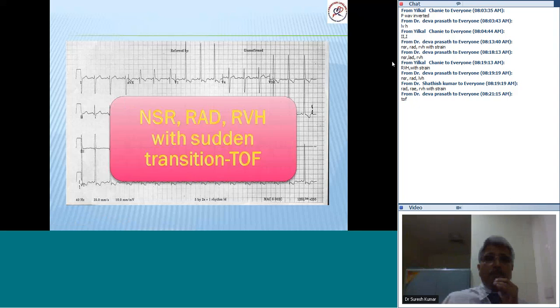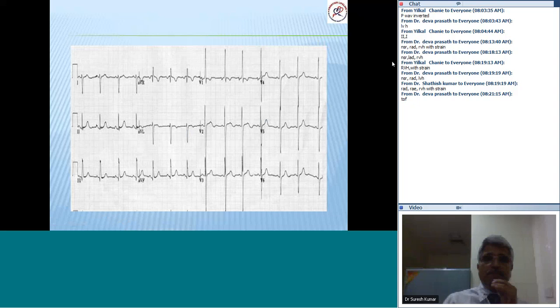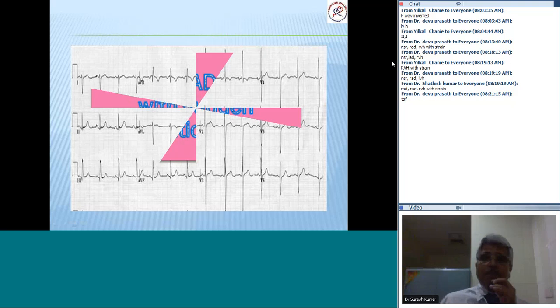See this now. Same thing. It's just that the transition is less dramatic.